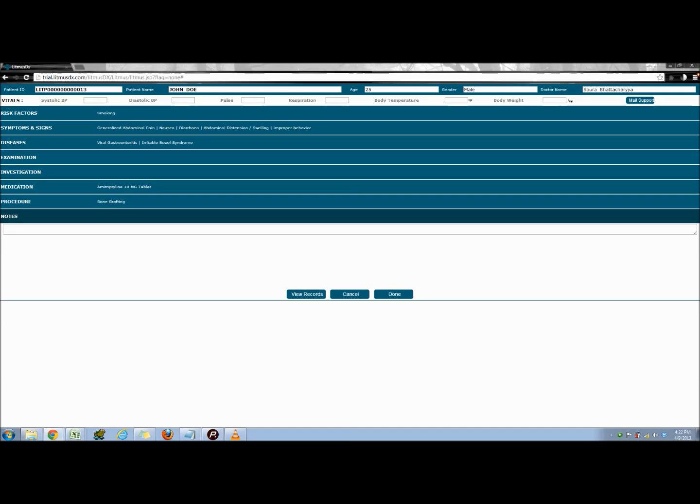It would really help us, of course, if as an alpha user you also entered the body weight of the patient, because as a lot of you well know, a lot of dosage information, we roughly estimated about 15% of all treatment protocols, actually depend on the weight of a patient. So right now we're using the Indian standard codes to look up weights based on ages, but it'd be really helpful if you gave us some indication of the patient's body weight. Even a visual estimate would be quite accurate and help us prescribe better.